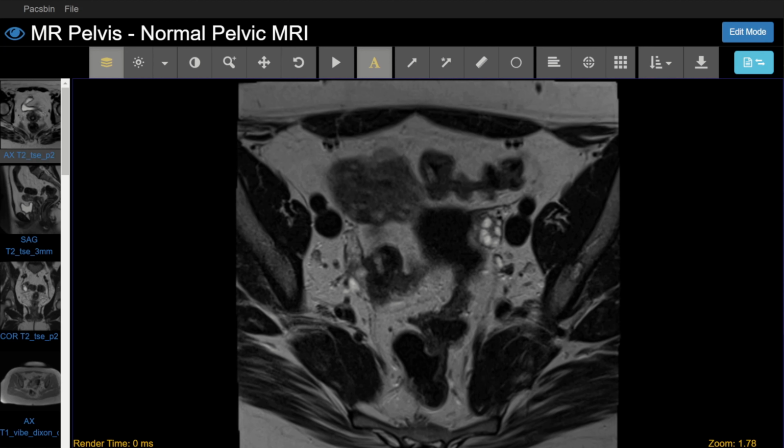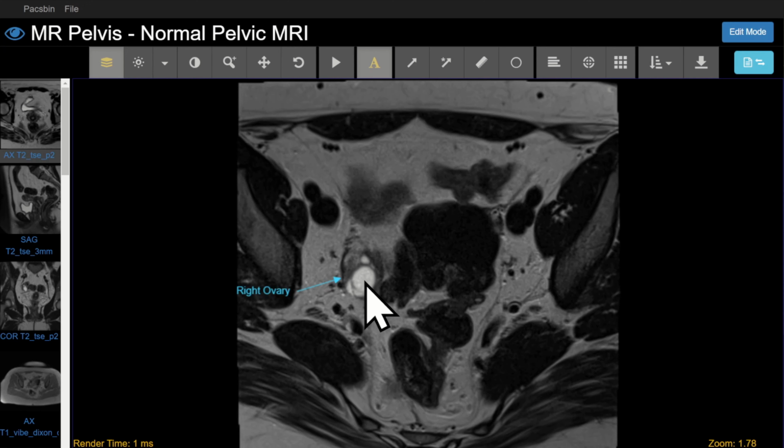Okay, so regarding what normal and abnormal is when it comes to the ovary, you need to remember that in premenopausal patients, with every cycle, the following will happen. So you'll have follicles in the ovary early in the cycle, like we're seeing here, and then you get a dominant follicle that will look like a larger simple cystic lesion, which is normal.